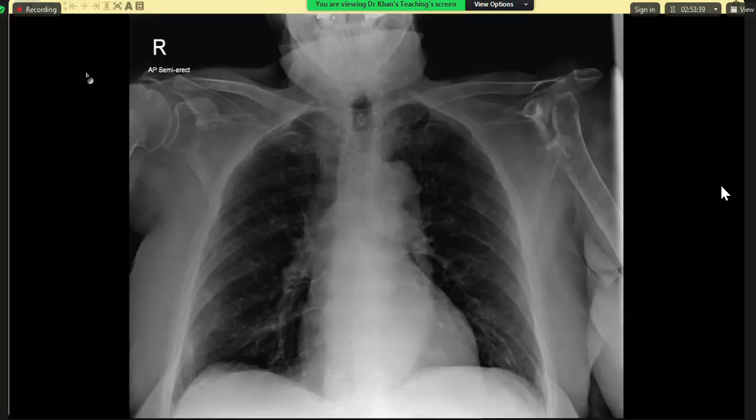There is some apical haze seen in the right apex region. Neck soft tissues are normal. I cannot appreciate any abnormal reticulonodular shadowing in the chest, and the heart is normally visualized.